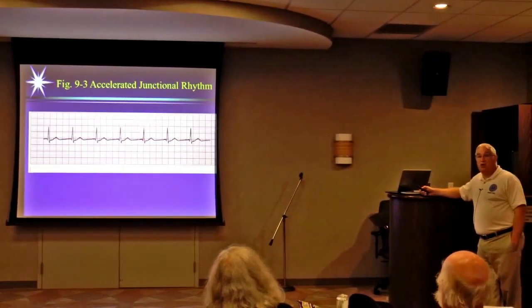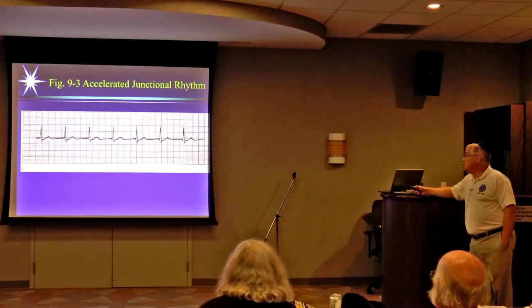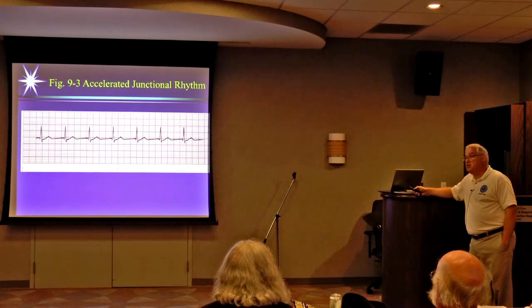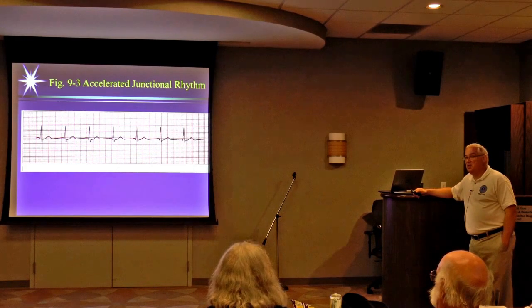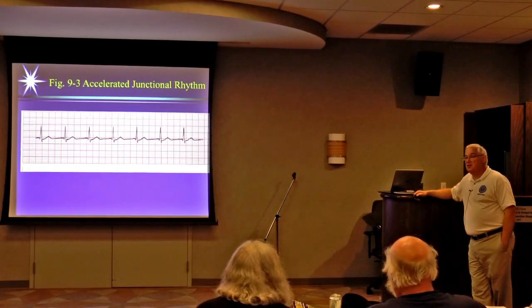Is the patient going to call you if they're in this rhythm? No. 1, 2, 3, 4, 5, 6, 70. Heart rate is 70. This is going to be found anecdotally for some other reason, that this patient got an EKG for some other reason. In other words, they called you because they were dehydrated, or because, I don't know, and you just happened to put the EKG machine on them, and you saw this rhythm, and you're like, I don't see any P waves.